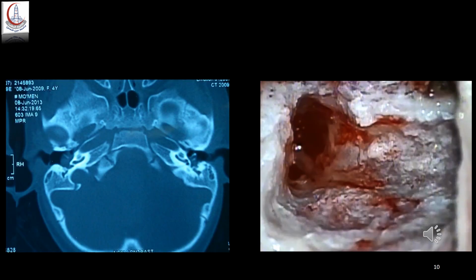In contrast, if we look at this mastoid, this is a poorly pneumatized mastoid, and as you see, there are no air cells. This means that all anatomical landmarks will be hidden, and we have to drill out the mastoid very carefully to create a cavity which is expected to be narrow with difficult access to the middle ear through the posterior tympanotomy. So we are prepared beforehand for surgical difficulties and loss of the normal anatomical landmarks.